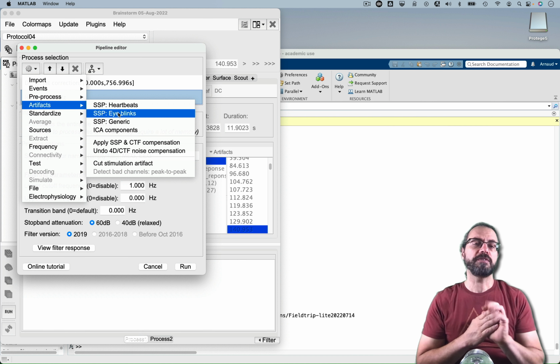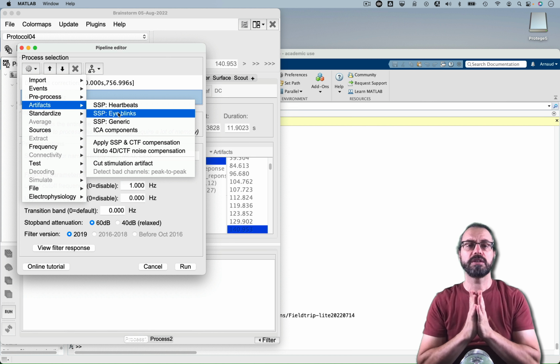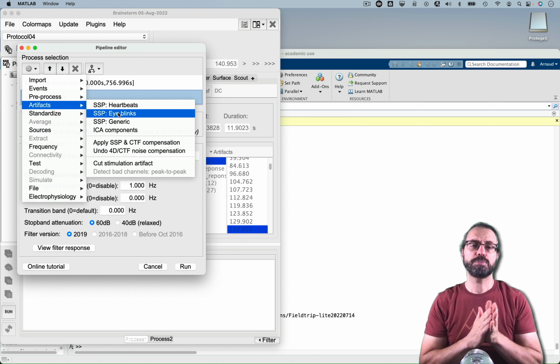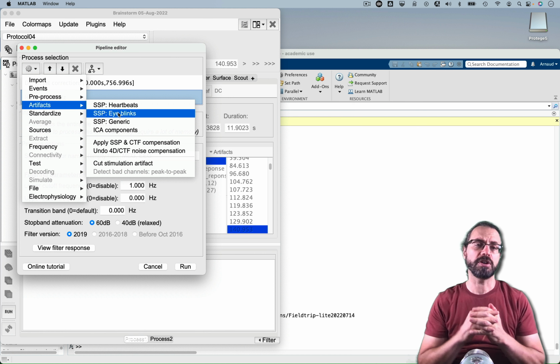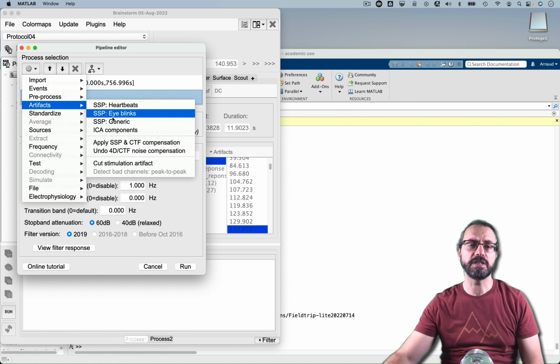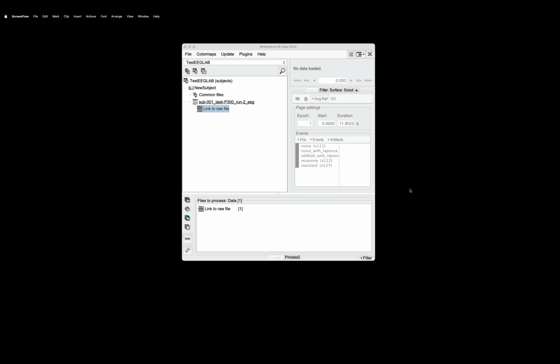I actually found a method to first flag some of the artifacts and then try to detect them with this. It's pretty complex, and here I only spent a couple of hours, so I decided not to use that method because I couldn't get it to work. Actually, I found how to make that method work later.